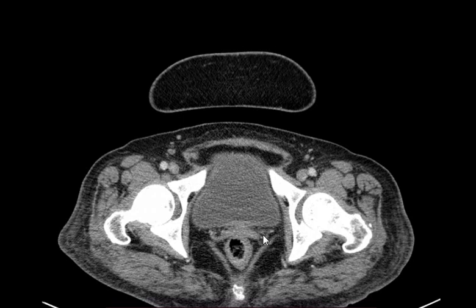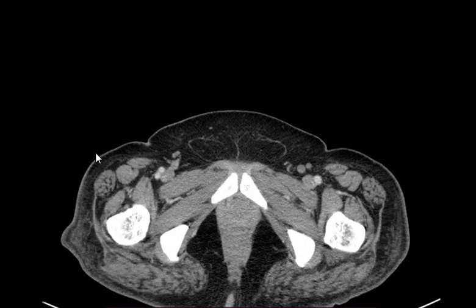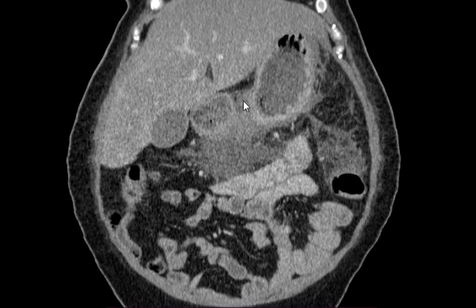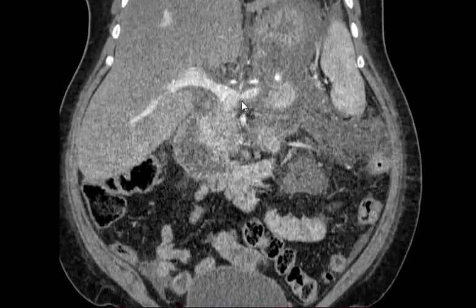And what retroperitoneal structures do we have? The main ones, let's say, are the kidneys and the pancreas. Of course, there are some here and there. So, let's see the coronal images and how they look. So, we can see here what?